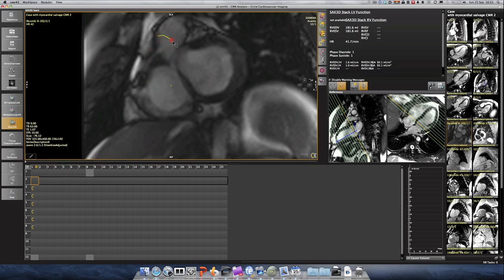If you were, for example, to say, I want to include this bit, and that's how you do it. Again, you might want to use Bezier lines, you might want to do the drag contouring. If I click this on, I drag the contour, you can see I can alter it. Or you say, actually get rid of this, I want to manually adjust, you can do it. So I think that's the RV in terms of manual contouring. You use this for endocardial contour.